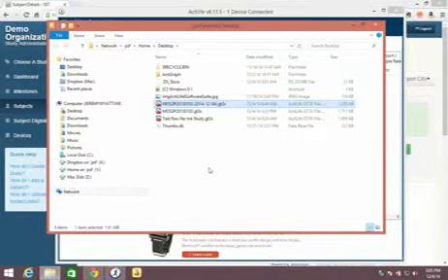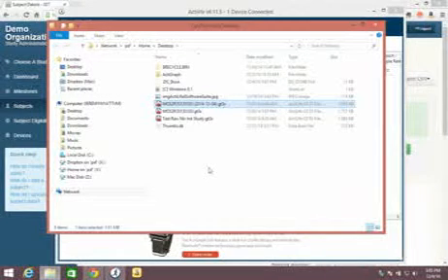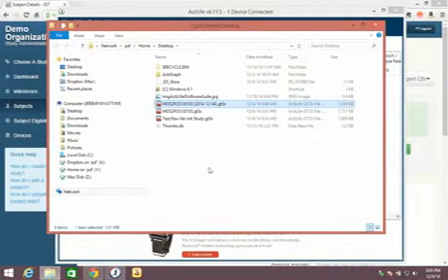And so, as you'll see in the next couple of slides that I have, we're going to target MATLAB, we're going to target CSV, we're going to target SAS. We're going to target several platforms and file formats that are really popular. I know the EDF, European Data File Format, is popular as well. So we'll target all of those. But for now, if you have the GT3X file, you can export it using ActiLife into any format you wish.